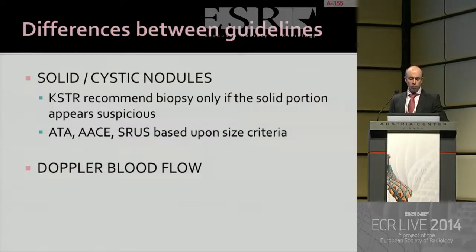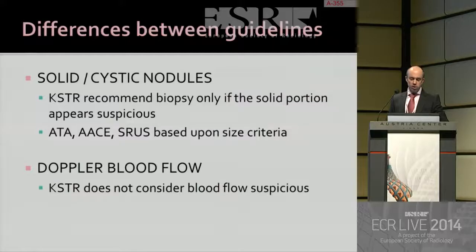And then finally, Doppler flow. The Koreans do not consider blood flow to be suspicious, following work by Moon et al. showing that there's no significant difference in internal blood flow between benign and malignant nodules, whereas the others do use it in some of the guidelines.